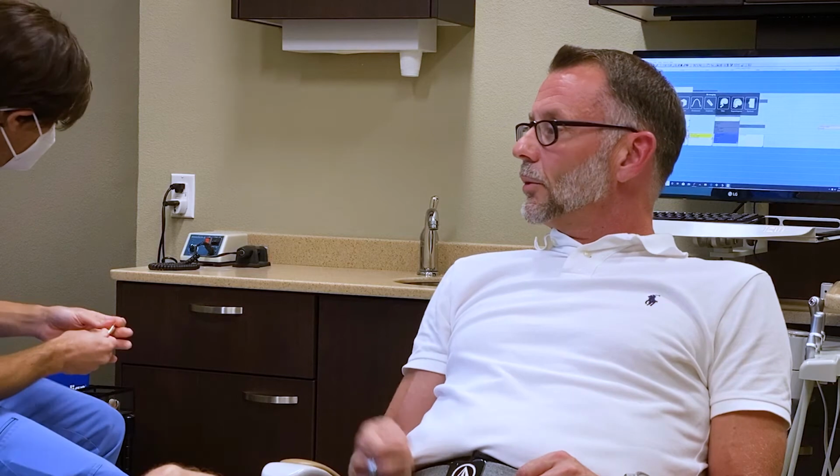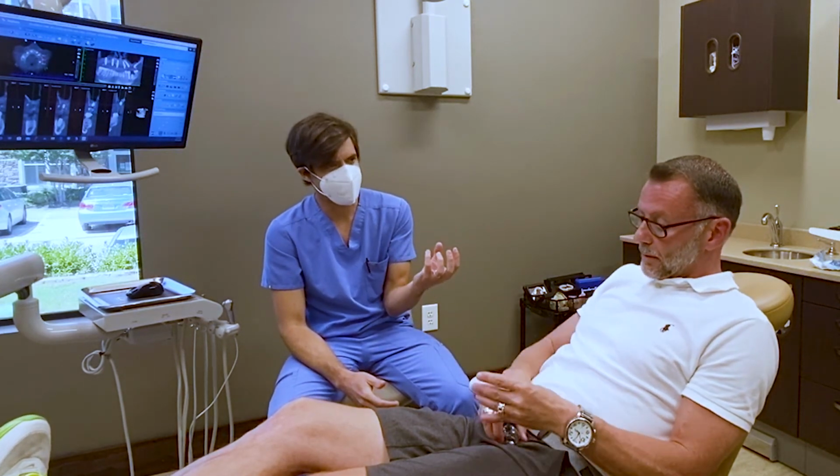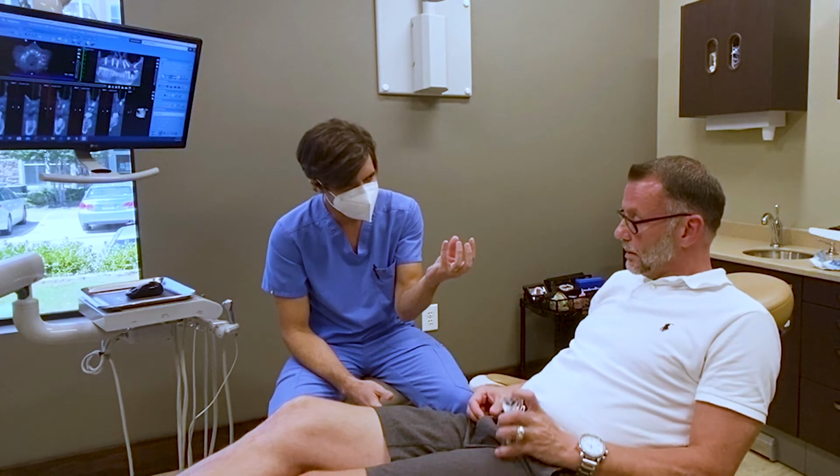I mean, I've heard it used, and with all my stuff with MIS and all that, I've heard these talked about, and I'm going, what's the difference between a stock abutment? I know there's custom, I know there's stock, and then there's multi-unit, and I'm like, okay, I get the custom, I get the stock. What's multi-unit? And now I know.